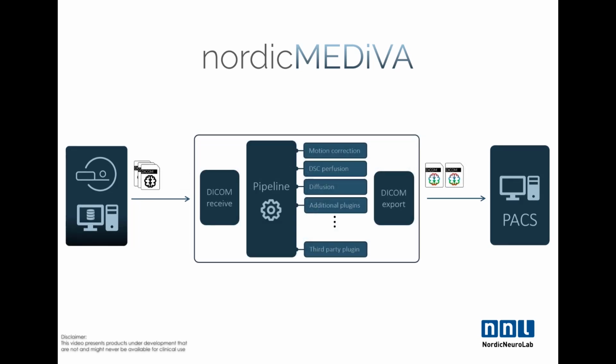Inside the platform there are many parts. First, the incoming data is received and sorted. Then a pipeline takes the data through the various plugins that will analyze the data. So far we have added motion correction and DSC perfusion capabilities. We will also add additional plugins, and it's possible to integrate third-party plugins.